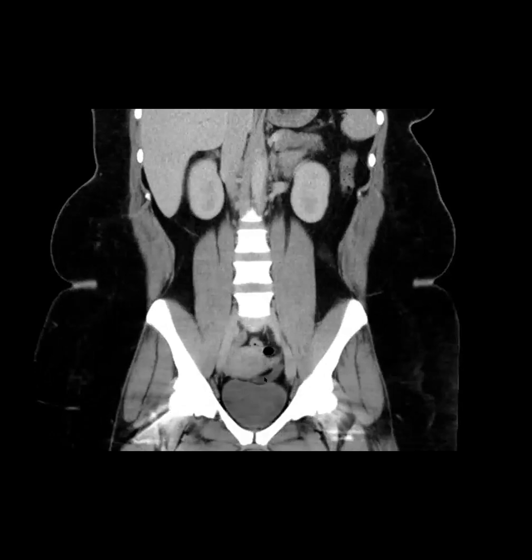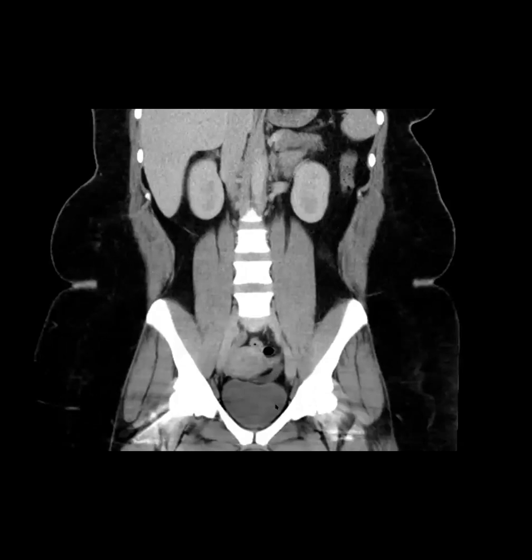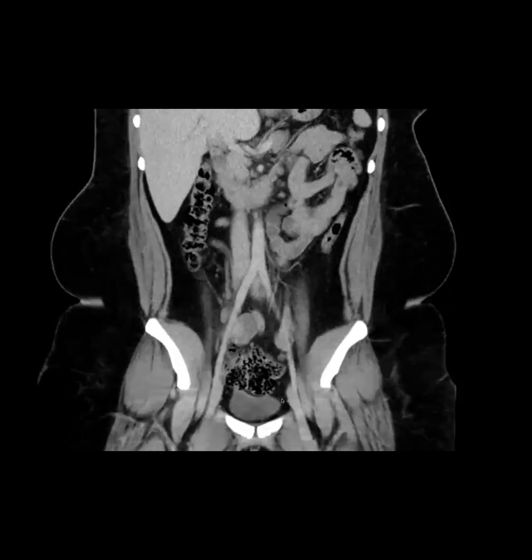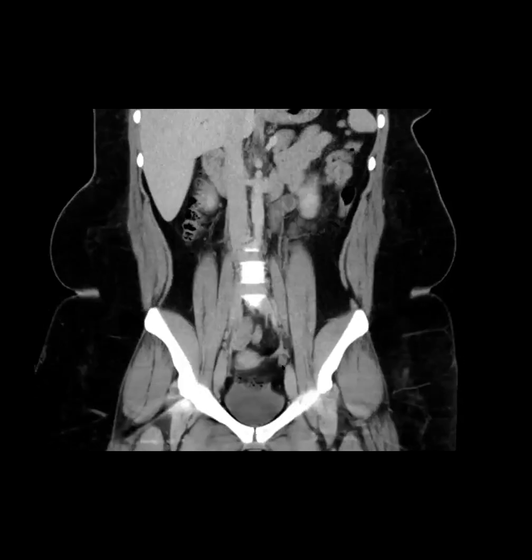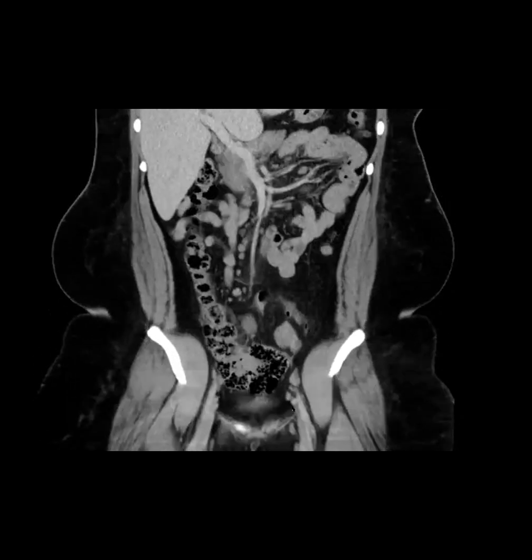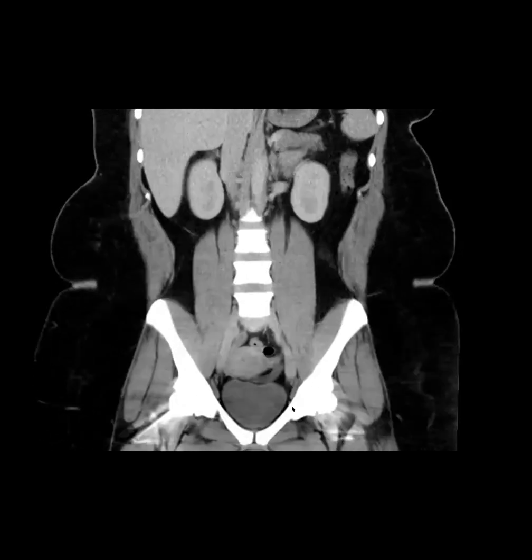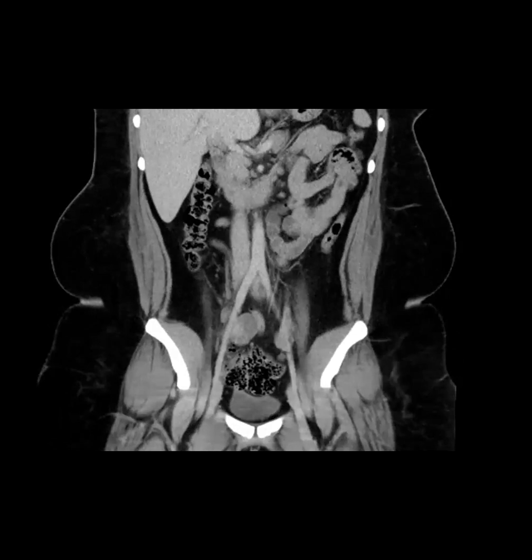I'm going to talk a little bit about the different mucinous tumors. But do you think you would have called this a mucocele here? I would have, yes. Okay. I was thinking, I would have said fluid-filled appendix without periappendiceal fat stranding is atypical for appendicitis, and there could be an underlying mucocele, mucinous. Yeah. Okay. It has to be surgery.